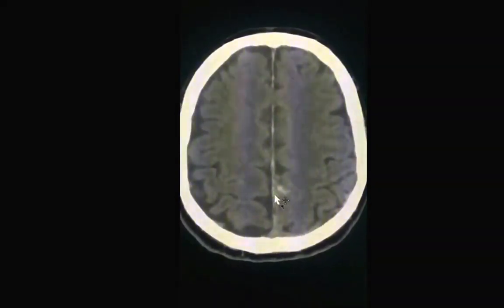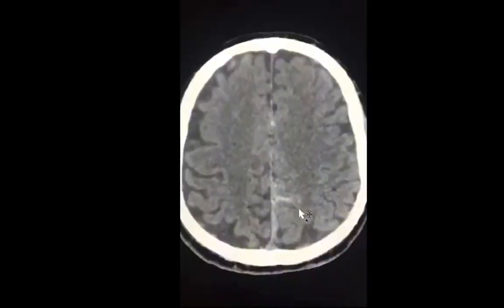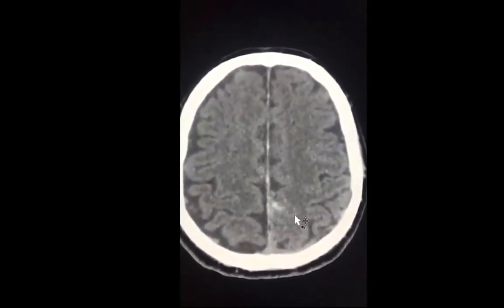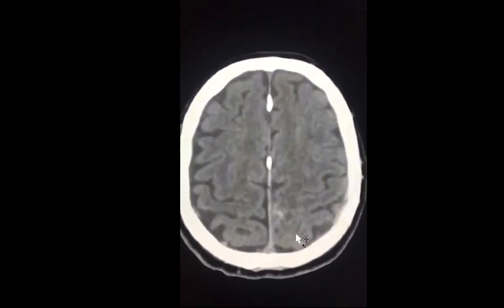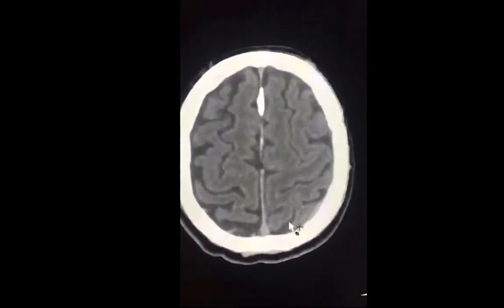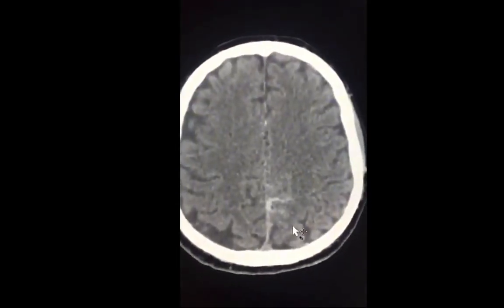Now let's go back to the initial CT scan where we saw the small subarachnoid hemorrhage. What we learned from this case is that we have to be very vigilant with cases of trauma. In particular, make sure you don't have any intracranial bleeds. That means that you have to take your time in looking at these cases and search for subtle findings as well.